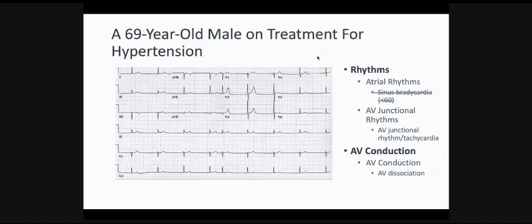So keep this in mind, and this is the main reason I brought this ECG. I know this is like the bread and butter of the ECG, but keep this in mind for the boards: if you find an AV junctional rhythm, and you coded a sinus rhythm, then delete that. Or if you code a sinus rhythm, then don't commit yourself to the junctional rhythm as well.